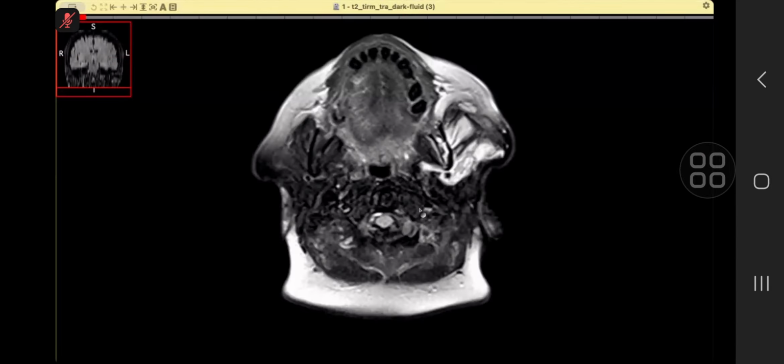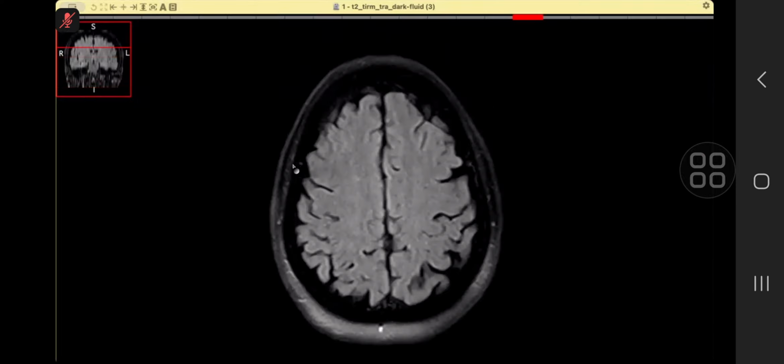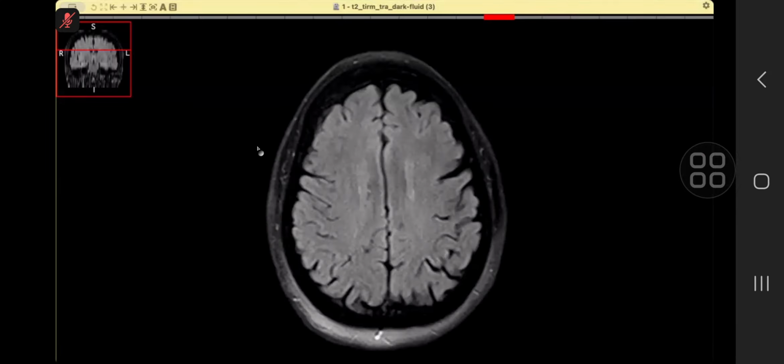So are you doing it intentionally? What's happening? The images are scrolling very fast. Okay. Let me scroll for you. Leave it. You leave it. Yes, right, sir. So I am scrolling for you.